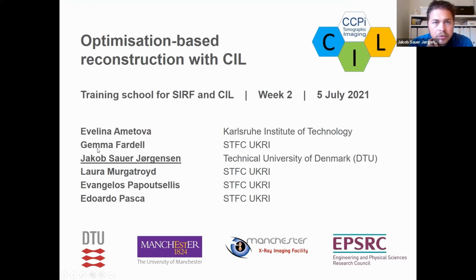So I'll take you through a small tour of using the Core Imaging Library for optimization-based reconstruction. It's building really a lot on top of what Andrew and also Chris presented just before. So that's great. Thanks for setting all that up.